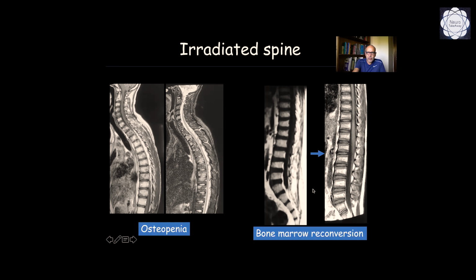On the other hand, we have to recognize these conversion and reconversion patterns that should not be confused with infiltration with the tumor.